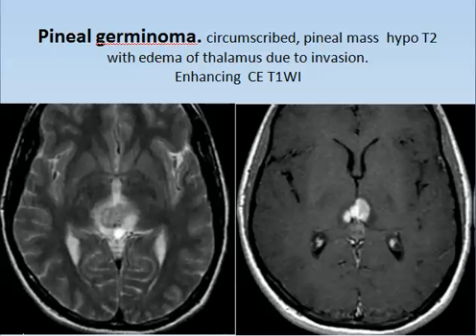Another pineal germinoma, a circumscribed mass, hypointense in T2 but intensely enhancing in T1 weighted images, with edema of the nearby thalamus. The thalami on the right and left side are edematous.